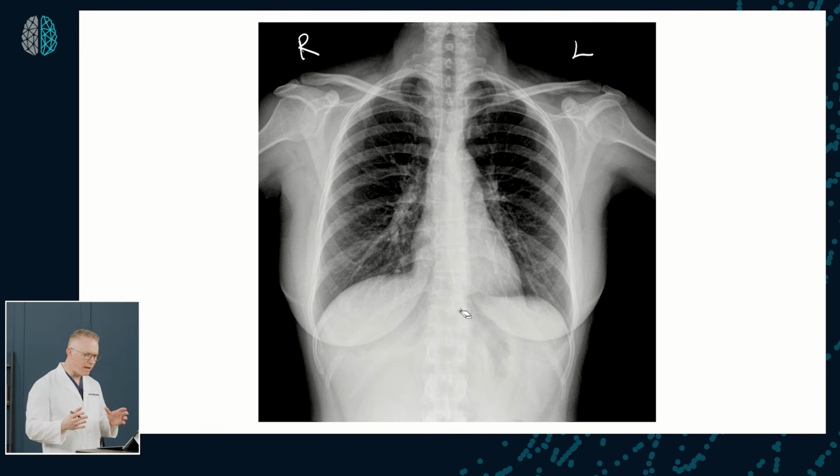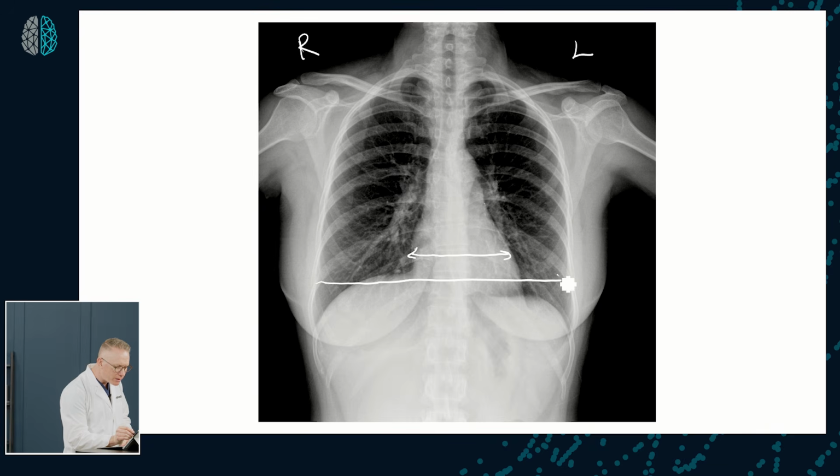Now some of you may be asking, why did you not cover the cardiothoracic ratio or the CTR? And you're right to consider that when we talk about the cardiac silhouette, because what you are considering is this width right here compared to this width. But remember, that should predominantly only be done on a posterior anterior radiographic image.